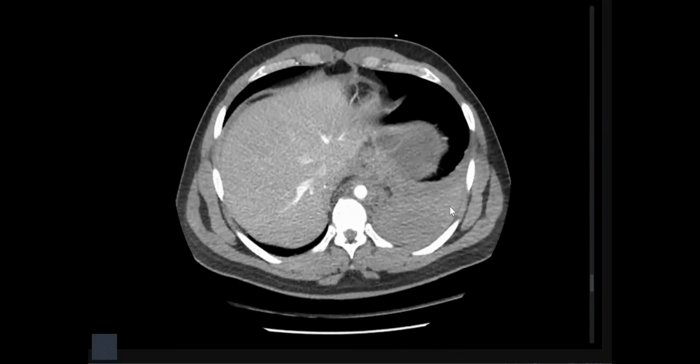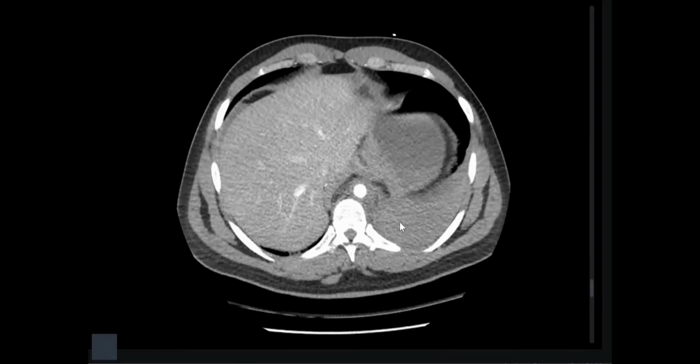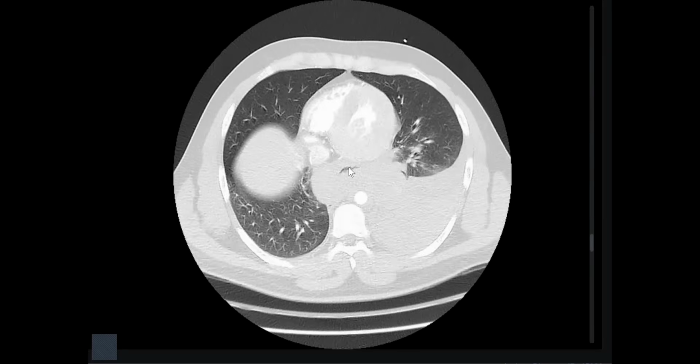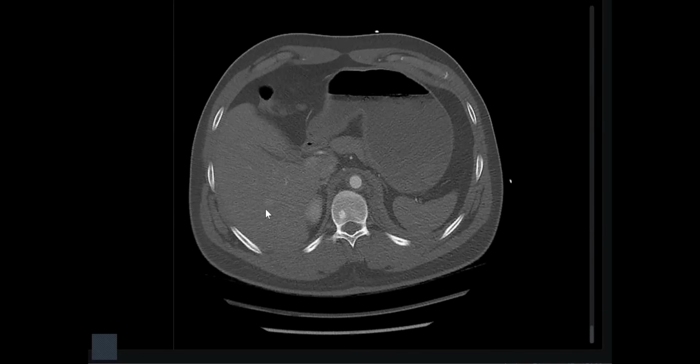Mediastinal hematoma and hematoma in the left pleural space. I would also like to see, in my routine practice, a lung window to rule out any pneumothorax as there is a history of trauma. I would also see the stacks of abdominal images, and the bone window for any fractures.